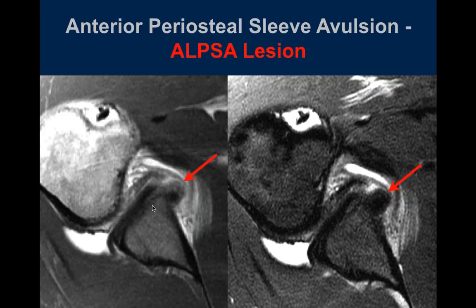Right. But I'm pointing this out because whereas the Perthes lesion is not really an important thing surgically because it doesn't change what they do, having the labrum displaced and scarred down to the bone does change things, because you have to describe it so the surgeon knows when they go in there to repair it that they're going to have to free up the scarred labrum, put it back in the normal location, and then do their surgery. So there's a lot of scar tissue there, and it's very helpful to the surgeon to describe it.